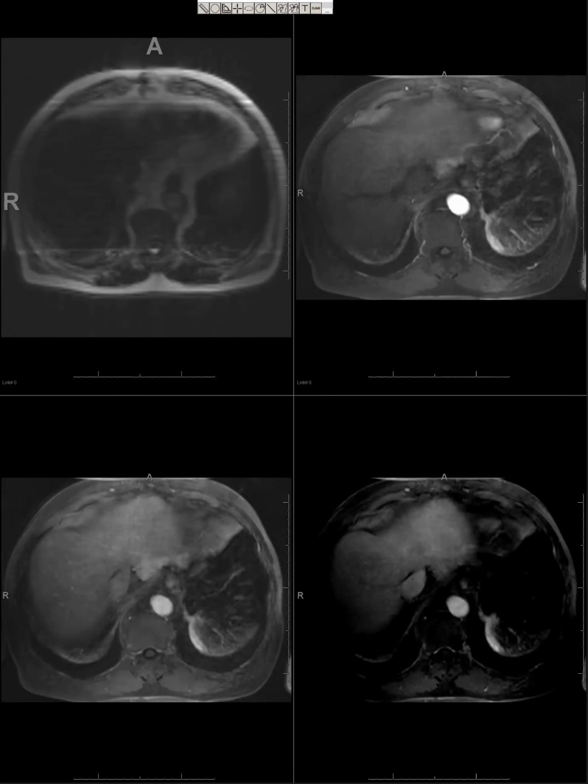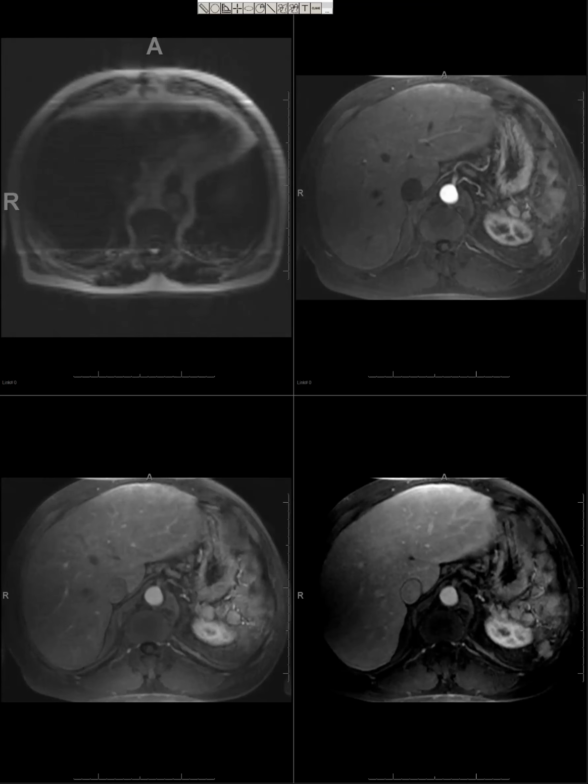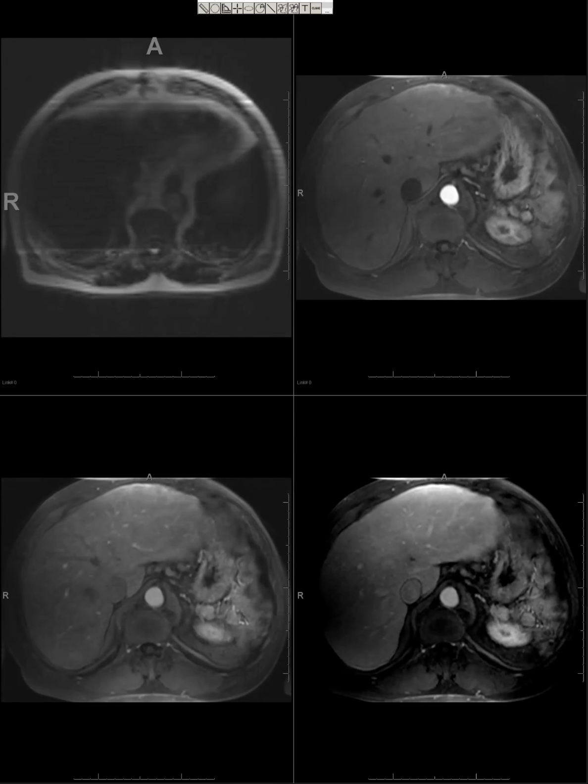And then the other one's a little bit harder to see. But we figured it out in time to avoid biopsy. I don't think we confirmed it in any other way than just following it. And I think we had some remote priors where we thought, oh, whoops, we should have looked at those sooner. Is there splenosis also in the splenic bed? It seemed like I saw some nodules over there. There are some nodules here as well that are regenerated splenic nodules.